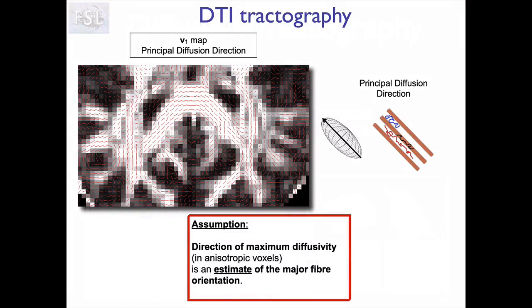So we already saw an example of tractography using the diffusion tensor. So in this talk, we'll look at what the limitations of this diffusion tensor tractography are and how we can use BEDPOSTX to go beyond what we can get from the diffusion tensor.